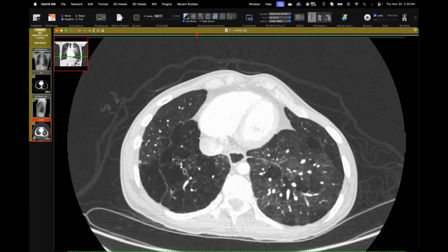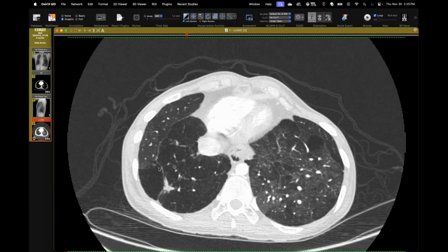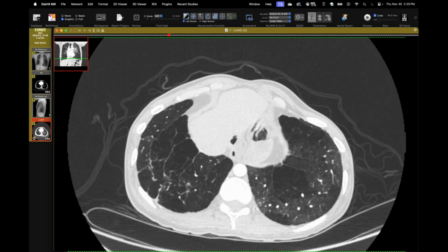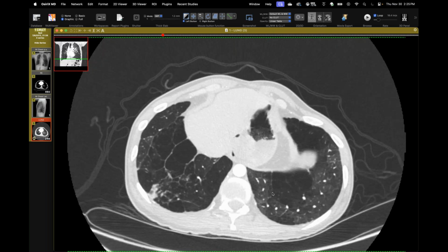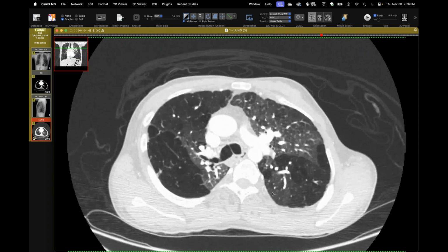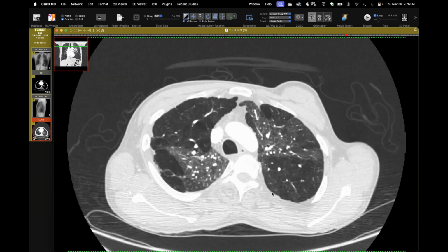And then I don't see any real cystic spaces. I think these are just either emphysematous or hyperinflated areas, probably hyperinflated, given that it can still make out the lobular architecture. So then I know the names keep changing. We would have called this bronchopulmonary dysplasia, but apparently there's specific criteria. So, or it's chronic lung disease of prematurity, but effectively the same thing.